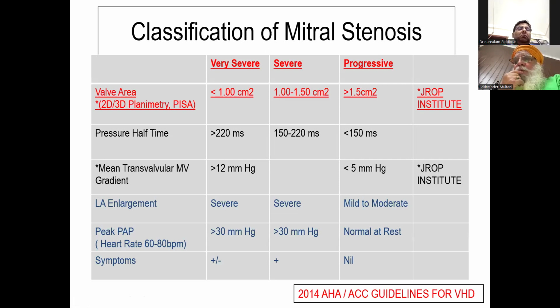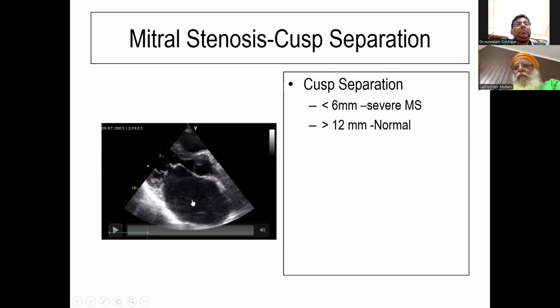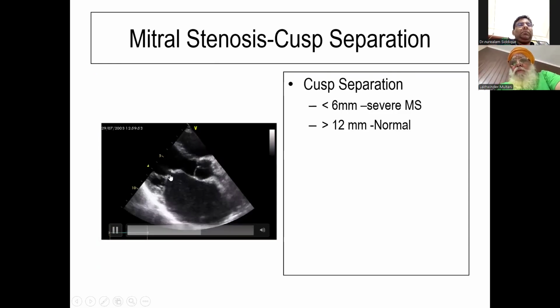Dr. Ripan, go ahead. Good evening, sir. Sir, can you please explain regarding cusp separation? Very simple. Look at this film over here. Try to look at the maximum opening of this cusp. I'll try to freeze this maximum opening.